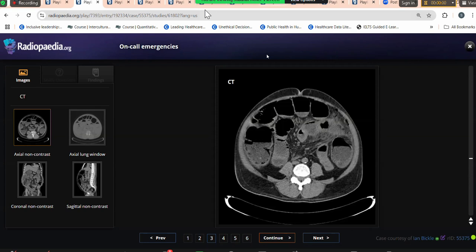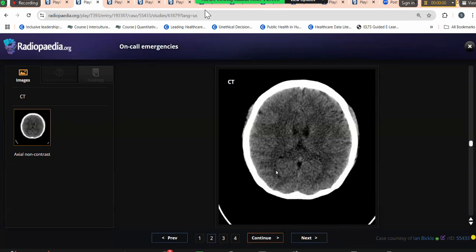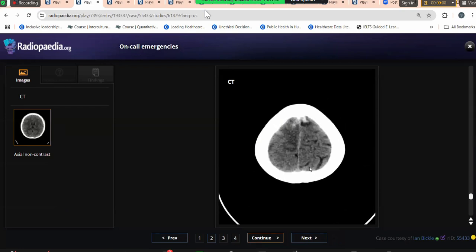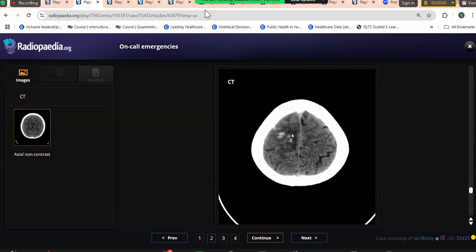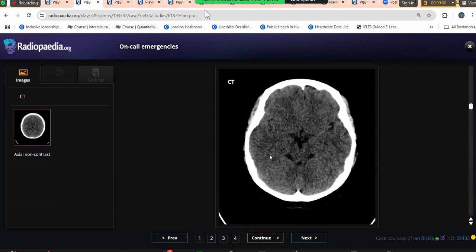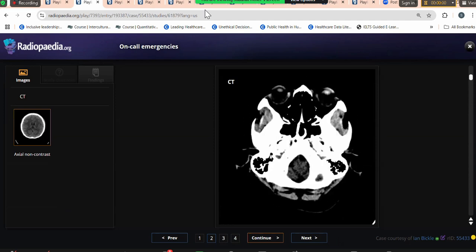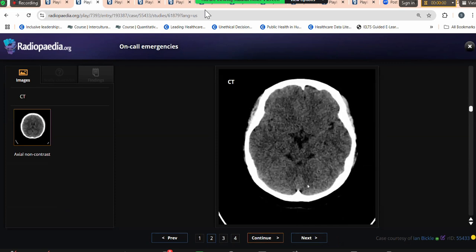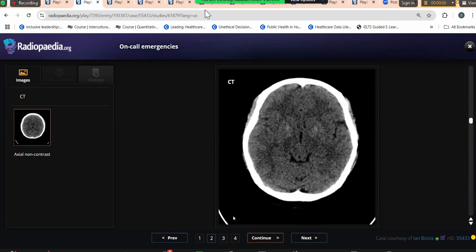Okay. This one again, this was a tough one, but I'm happy with how the candidate proceeded. She picked up that the patient is pregnant. She picked up that there is this hemorrhage. And you were very right in saying that I'm thinking of hemorrhagic infarct. And I do understand in the plane it's difficult. So you were saying that the sigmoid and the transverse is doing. So your way of thinking was correct.